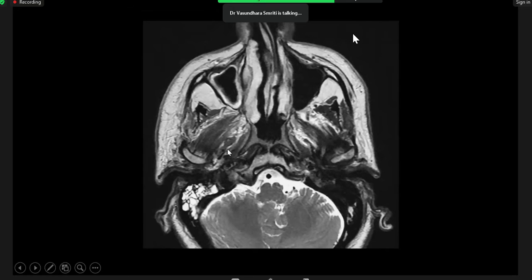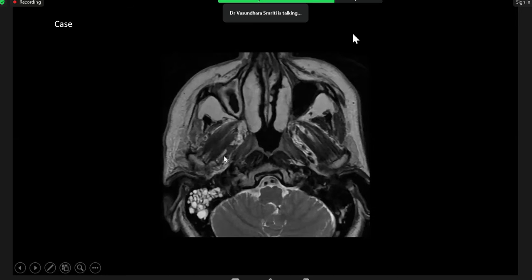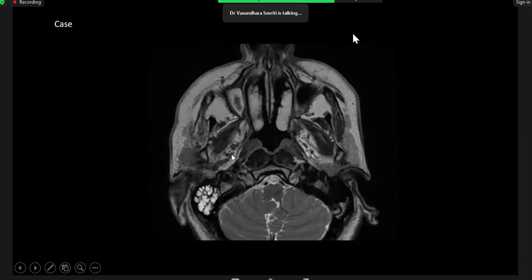Here there was a thickening of the mandibular nerve. This is a normal nerve on the left hand side. So this nerve is thickened. Here it has divided into three: lingual, inferior alveolar, and auriculotemporal. Here everything is thickened. This thickened structure, which is traveling to the parotid tumor, around this condyle is the auriculotemporal nerve, or the third division of the mandibular nerve. It had gone and caused perineural spread into the main mandibular nerve, and then there is an antegrade spread into the lingual and the inferior alveolar nerve.